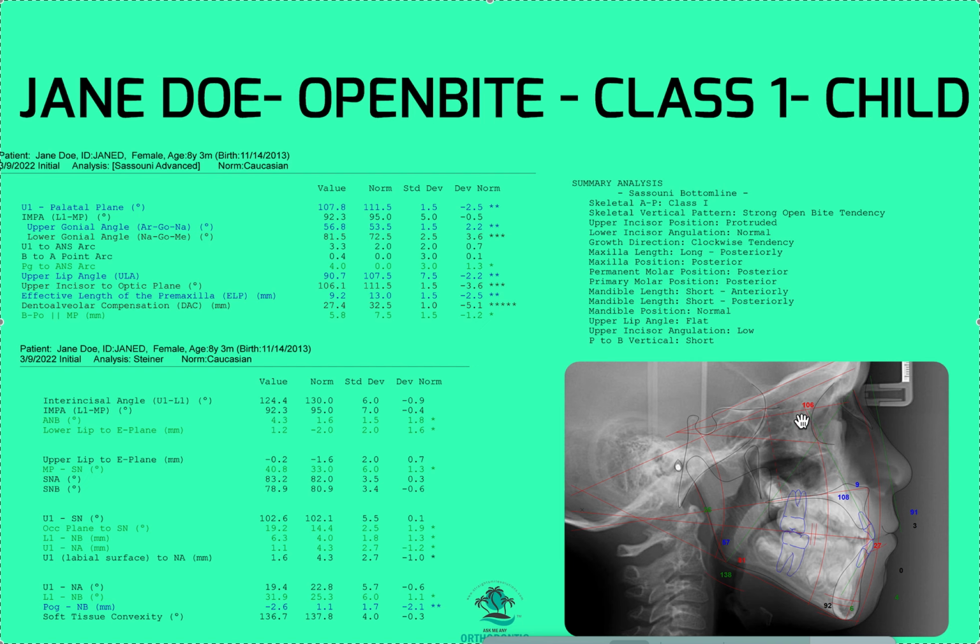This is like a regular vertical grower open bite look that you see, and most likely has some type of airway issue. If I had to guess, if you took a look at this patient's tonsils, I'll bet you they're nuts. So there's definitely either a problem with the nasal airway or a problem with air blockage in here, because you can see how tiny this is. It shouldn't be this small. So this patient is a huge red flag to me.